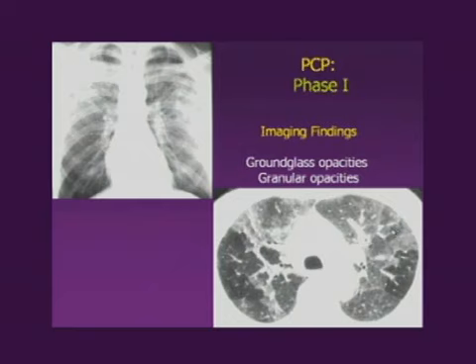The imaging CT correlate here, again, shows regional zones of ground glass attenuation. I'll stop for a moment because I realized I'm using the term ground glass and I haven't defined it. For those of you that don't do a lot of lung imaging, it's a term in our lexicon which describes hazy increased density such as this through which you can still see the underlying anatomic structures. So we're talking about a smoked glass, like an Absolute vodka bottle or a Grey Goose vodka bottle, that smoky appearance.